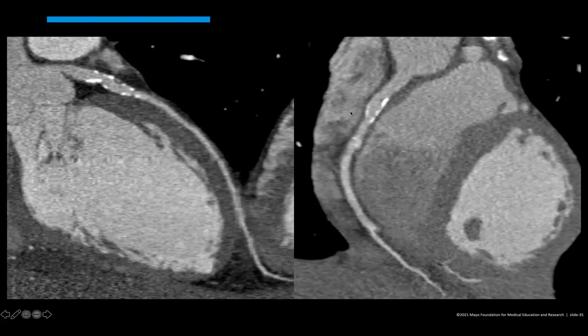So when you're looking at this coronal oblique image, look at the lungs. That's going to be one of your first clues. So we have the right lung and the right heart border. If you think about your chest x-ray, that is the right atrium. The right ventricle is in the middle, so we don't see the right ventricular heart border anywhere on a frontal radiograph.